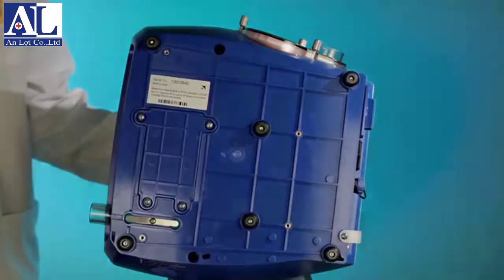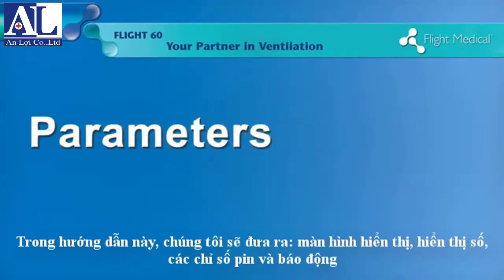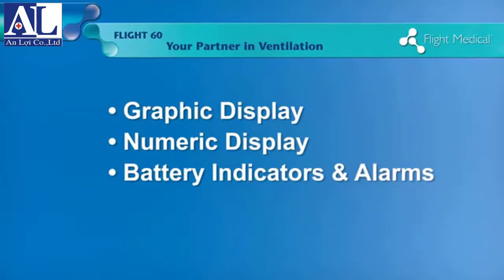Welcome to the Flight 60 Ventilation Parameters Monitoring Training Module. In this module, we will cover graphic display, numeric display, battery indicators, and alarms.